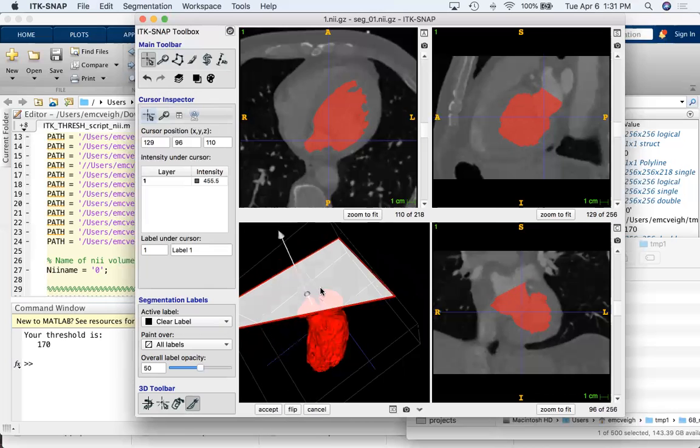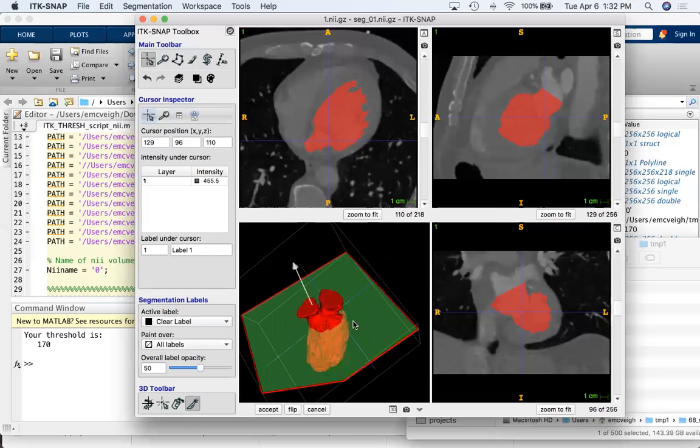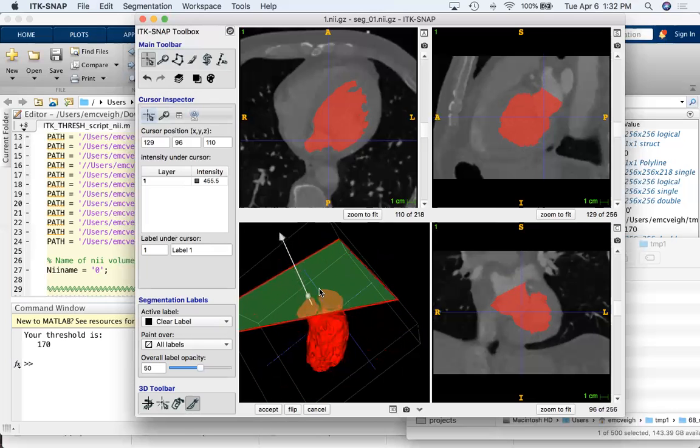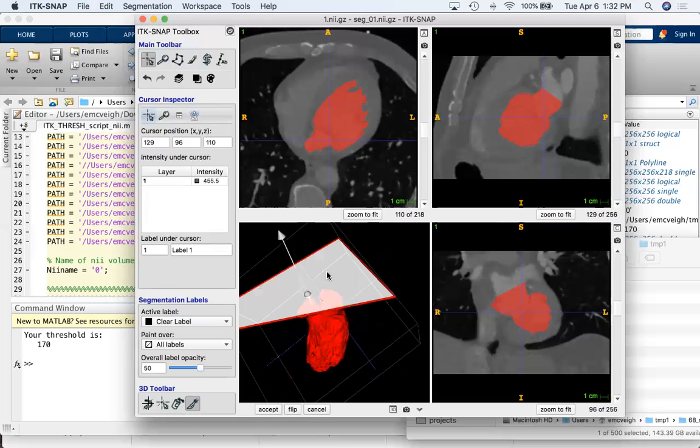In my case, the problem is moving when I do that in Windows. What's moving? The plane? It rotates. No, I don't see a plane. I cannot define. Here, let's I don't know why it wouldn't be working.